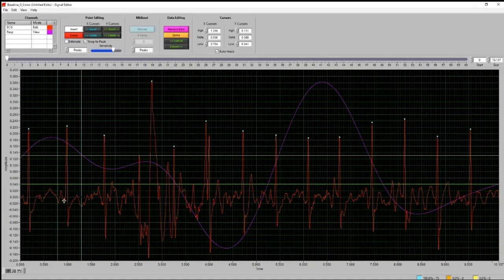So really those atria depolarizing is what we see, this P wave here. And we really want to see that in almost all beats. It's not a mandatory part of the QRS waveform, but it certainly can help us when the data are messy to confirm that it's there, or in instances in which we suspect that this person may have some ectopic, which just means not normal physiology, or some ectopic beats.